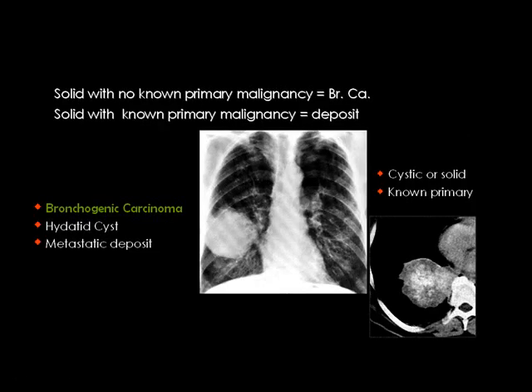Okay, this is the mass when a CT scan showed solid nature, but it showed calcium inside the mass. Then calcium in the mass is of no diagnostic value. Calcium in the mass you can ignore totally. It does not mean a benign lesion. Calcium in the nodule is very important, but calcium in the mass is of no significance.